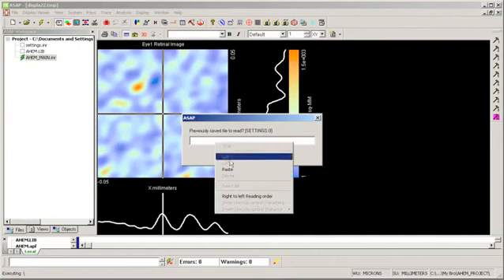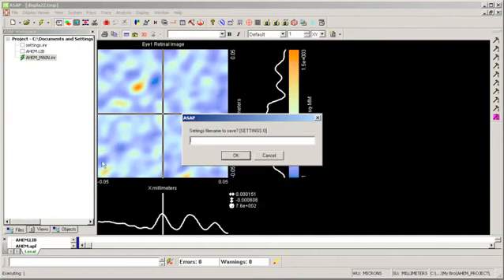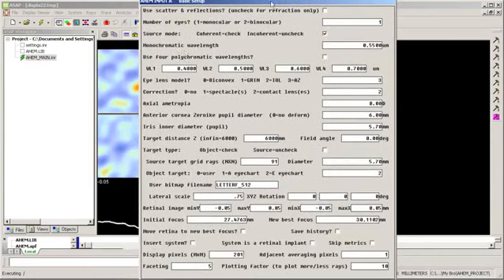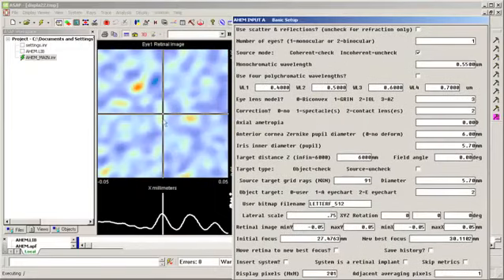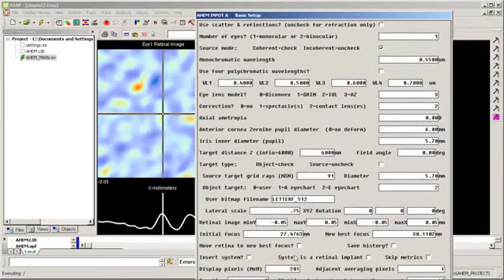I've got a settings file with a contact lens. And I go to AHEM and my basic setup. So now when I go to correction, contact lens, or lenses if I had two eyes, and the rest of my setup is fairly standard, and I'm also using a coherent application here. So I've got a retinal window, as the retinal window we saw here, and I've done some correction with a toric lens. So I click OK.